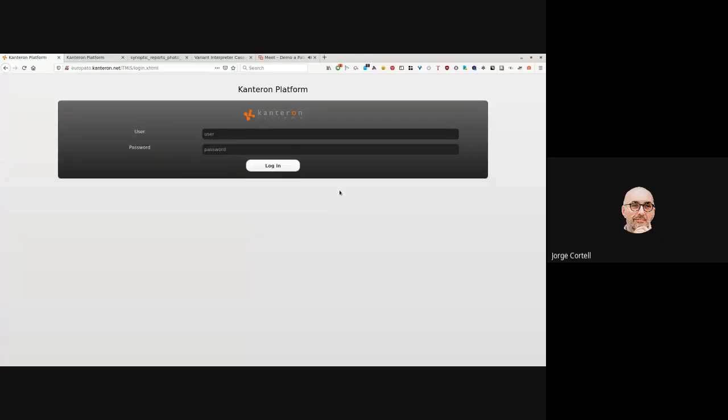All right, so before I start the demo, I have a couple comments. One is the application is delivered via web browser. It doesn't necessarily mean that it's stored in the cloud. It can be on-premise, hybrid, or in the cloud, but the user accesses it via the web browser. It's zero footprint, which means you don't have to install any software, any plugin, or anything.